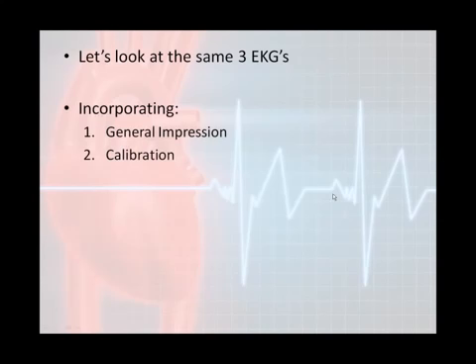Now let's look at some EKGs using the first 2 steps of the EKG interpretation process. We will determine the general impression and the calibration. Here we go.